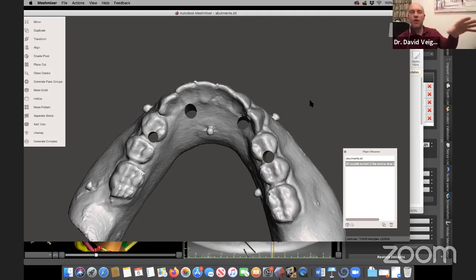The software won't be able to orientate the two DICOM datasets when there's such a mass of radiopaque material. So reline the denture with a light body silicone or a hard acrylic, whatever, to get that nice fit, but don't use a radiopaque material because it'll obscure the radiographic markers.